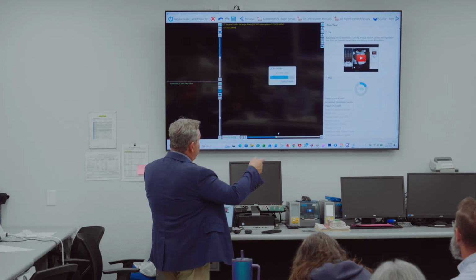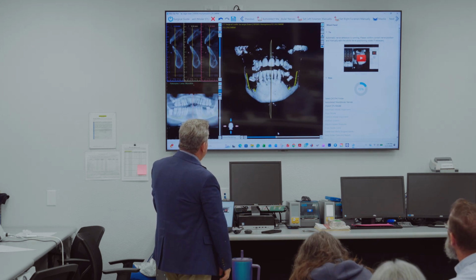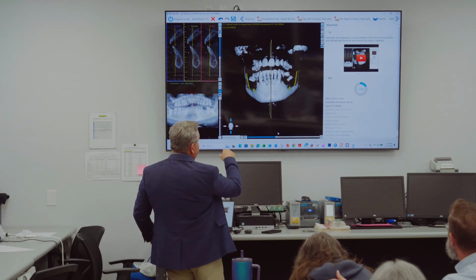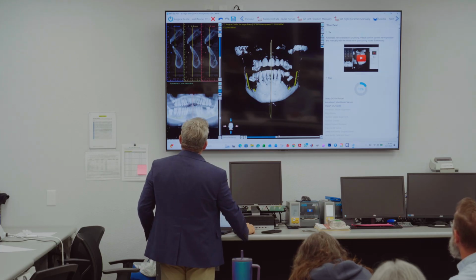Now it's starting to crunch. Now it's doing all the auto detection that we talked about, and it's already done it all, really. The only thing it has to do now is, after you click next again, we're going to upload the STL and it'll merge it. But for here, I want you to look at some of the features. So play with some of these buttons.